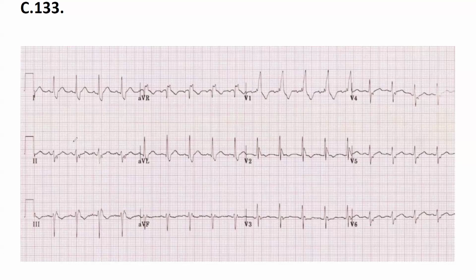Do we have P waves? Yes. Okay, positive in lead number two, negative in AVR. Good. Every P should be the same and followed by QRS. So that can be a sinus rhythm. Okay, we can measure the axis now.